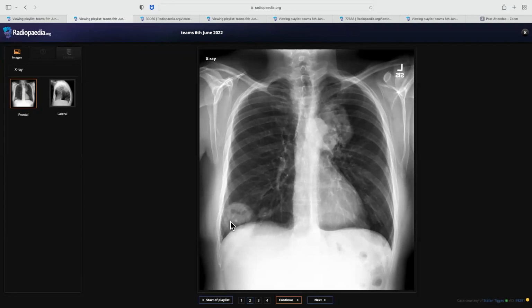You said there are lucencies, because my thinking process in the beginning was that this left lesion is a mediastinal lesion, then these are the other two lesions. That was my thought process in the beginning. Then I corrected myself during the description. Yeah, I understand. That does happen because one wants to be safe also.